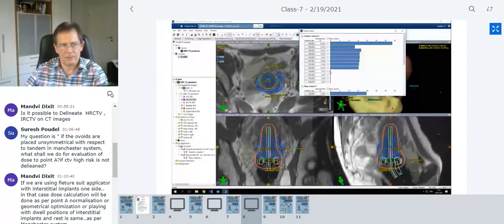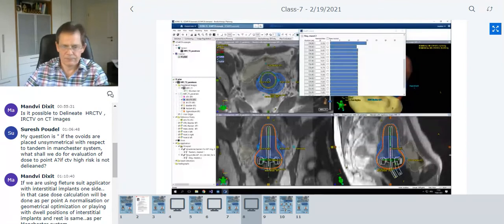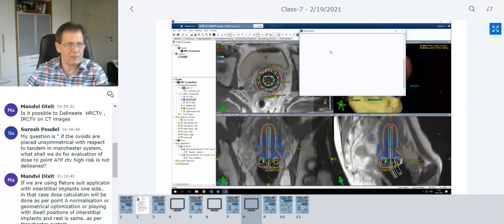Yeah, you can see that. Let's take another position. So we are shaping the dose. And the other contribution for the bladder comes probably more from the ring. So I can also go here in the ring, moving my plane in the ring so that I see this in a transverse plane. And here I can also hover my mouse in the ring channel and see where I am close to the bladder. So I'm just going to manually change the dose there just to see the effect.